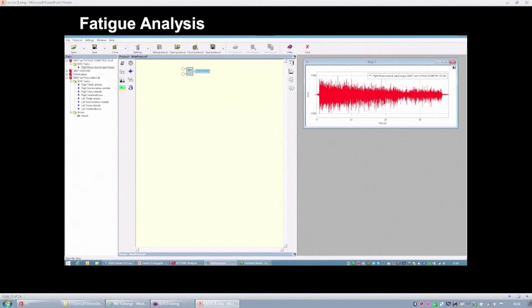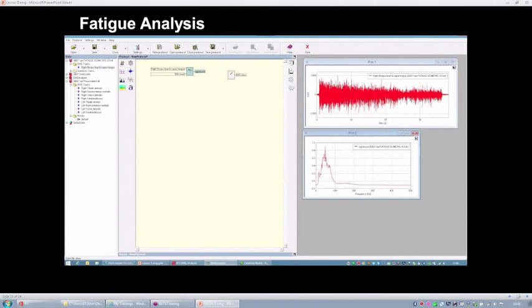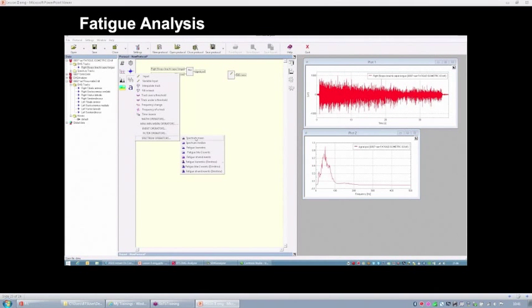So now I want to start by computing the spectrum, the power density spectrum of the signal. And I want to show you the shape. So this is the duration of the time window. Okay, so this is the spectrum, and as you can see, it is shifted to the left with respect to a typical spectrum, if you remember.